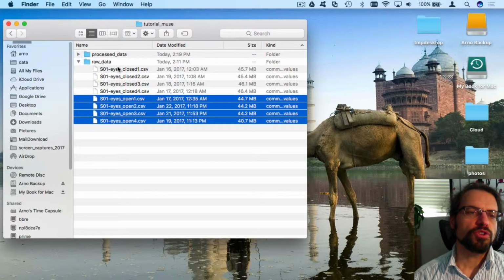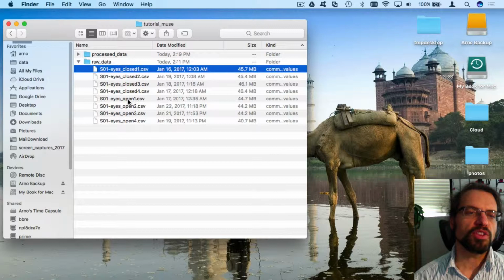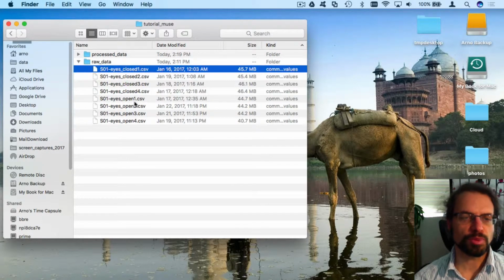And for the first day, so these were recorded on separate days. And for the first day, for instance, I recorded eyes closed before eyes open. For the second day, I recorded eyes closed after eyes open. Third day, eyes closed before eyes open, etc. So it is a randomized setting.